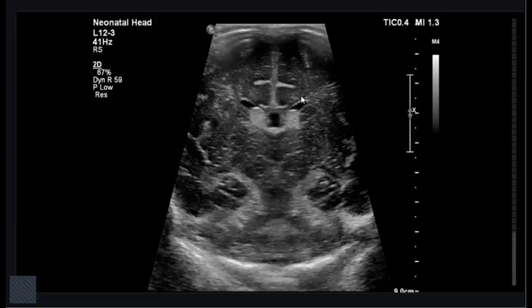I will also do a CT scan of this patient. Although there is no evidence of hydrocephalus, these findings should be conveyed to the neonatal team, and the patient should be managed by the neonatal team. Okay, this patient is 1 day old.